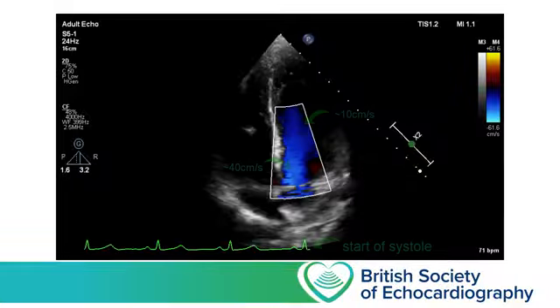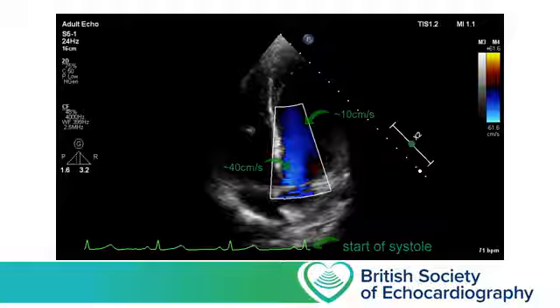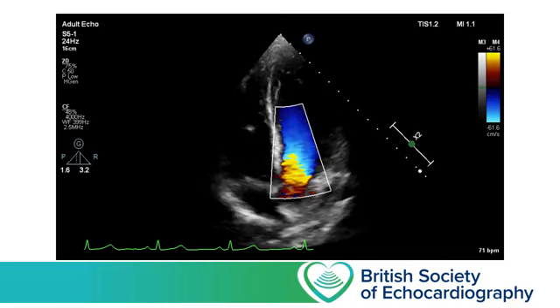So here we can see that systole is just beginning, we're just past the QRS complex on the ECG, and we have blood that is moving from the LV towards the aorta, and it's all displayed as a dark blue, so it's initially moving relatively slowly. Now, because this is a healthy heart, the pressure inside the left ventricle rapidly increases, and the velocity of blood leaving the LV starts to accelerate.